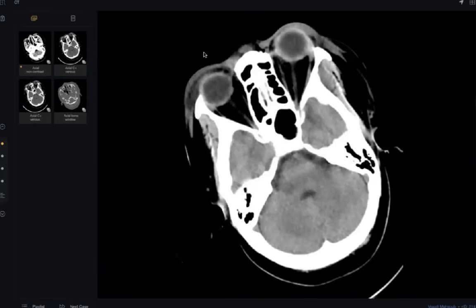The intraconal fat is clear. The extraocular muscles are intact. There are no masses, no focal lesions, no collections. The eye globe and the orbit are unremarkable. The rest of the brain shows no abnormal lesion, no hydrocephalus, no midline shift or mass effect.